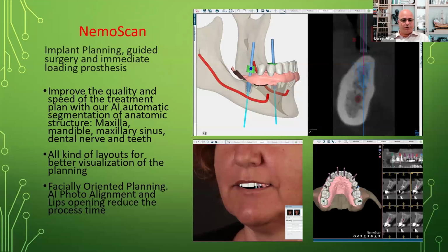In the demo I'm going to share with you, it's going to be two distal molars on the lower arch. Oftentimes, and maybe I'll age myself at this point, you open up a lab bag and the first thing you do is look at an impression, and all of a sudden the impression coping is going out to left field, and you scratch your head and wonder why. The access hole is going to come out in a very aesthetic area and may compromise the overall prosthetic. So you pick up the phone, and typically a dentist would say, well, that's where the bone was.